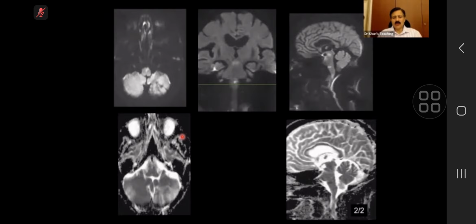And these days there is a lot of literature of doing 3-plane DWI. And in this particular case, this is what we did. In many of the neuro centers now, particularly in stroke patients, they are doing 3-plane DWI. So you do an axial, you do a coronal, and you do a sagittal. And on recall, this patient, we recalled within the next 2 hours actually. And you can see here was the doubtful finding, but now you are more confident.